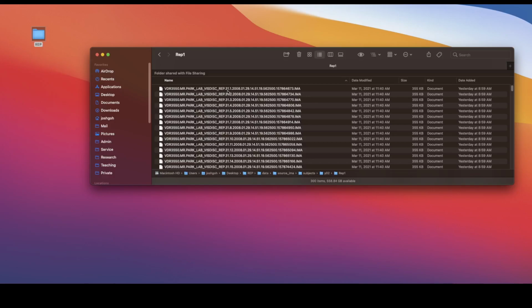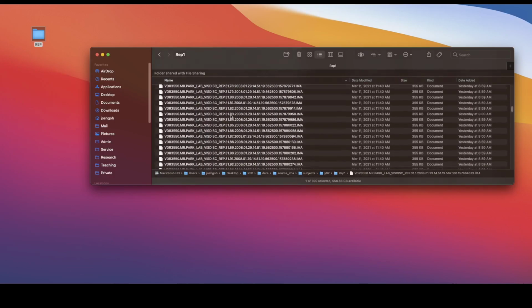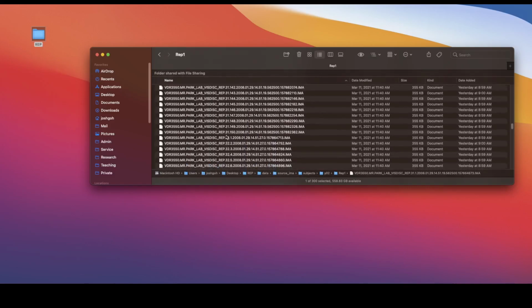Okay, so that means that for subject Y02, there might have been a few other sequences that were collected prior to acquiring this rep1. And that's not important, as I said. What's important is you know that this is rep1 because it's been placed in this folder, and then you have sequences, the sequence number that is the original one is .31 because it's the earlier one. And there are 150 of these, and then Siemens automatically generates .32, sequence ID 32, and we don't want that.